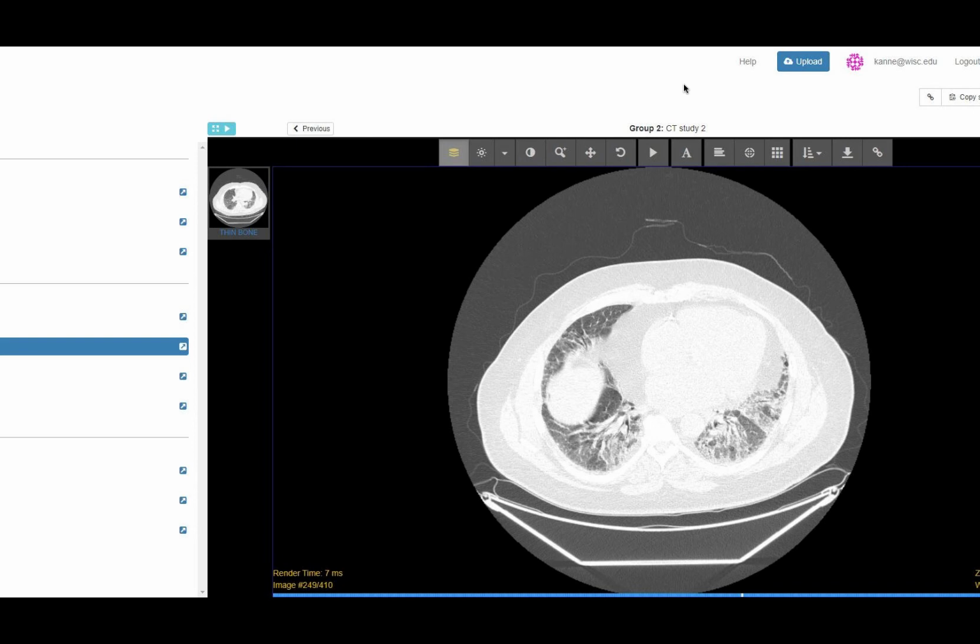Yeah, I had the full ILD workup. Nothing ever came out other than the sarcoid diagnosis. I've seen sarcoid evolve to a UIP pattern, and sometimes with exuberant honeycombing, no less. So I've not seen it go to an NSIP pattern like this, but I have seen it go to exuberant honeycombing. Has anybody else seen that?